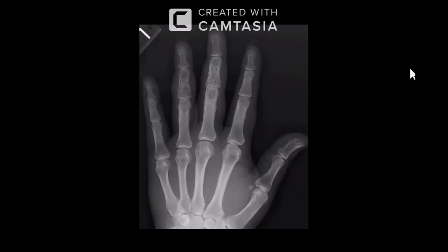Okay, so this is a frontal hand radiograph. I can see at the second and the third finger, at the middle phalanx, there is sclerosis with lucency seen within both middle phalanx bones. I cannot appreciate any cortical erosions. Looking into the joint spaces, they look preserved in both fingers around this bone.